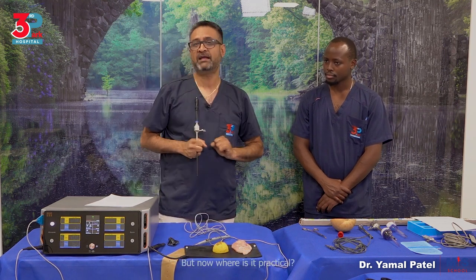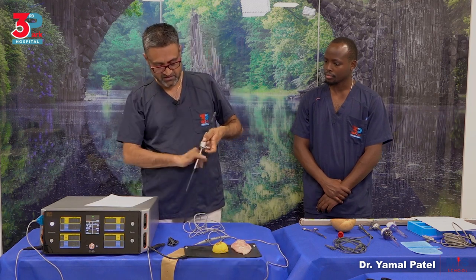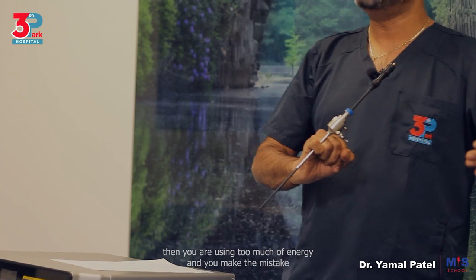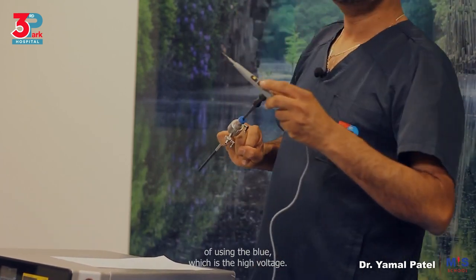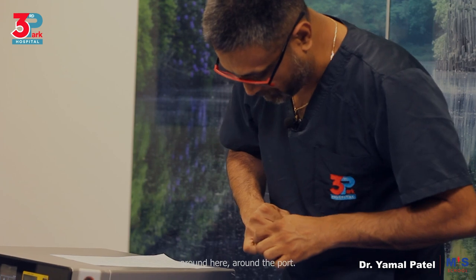But now, where is it practical? It is practical in one aspect. If you have a very thin patient with a wall thickness that is just that much, then you are using too much energy, and you make the mistake of using the blue, which is the high voltage. This area will slowly get charred around here, around the port.